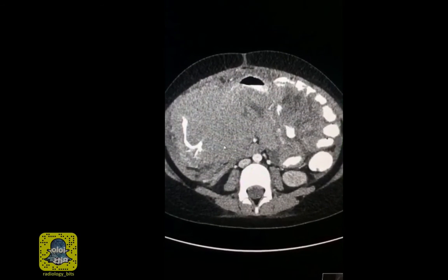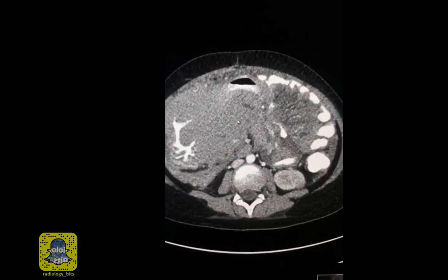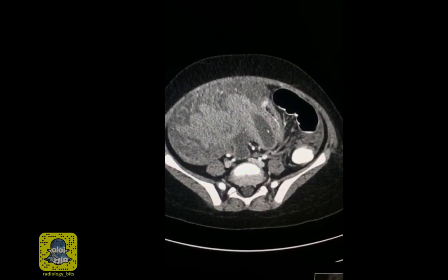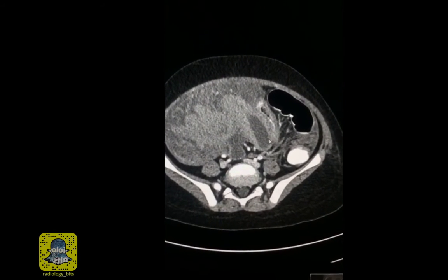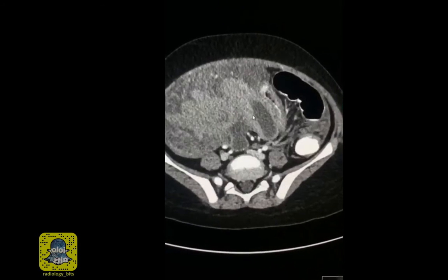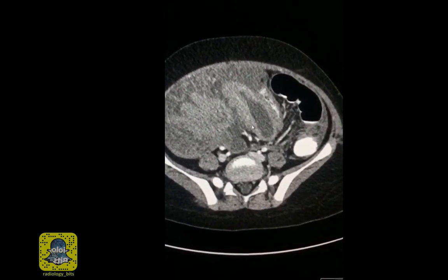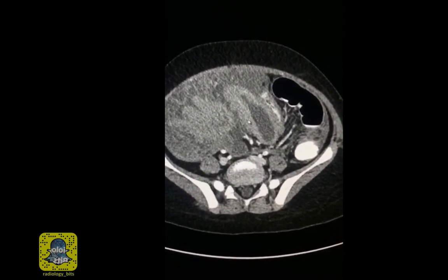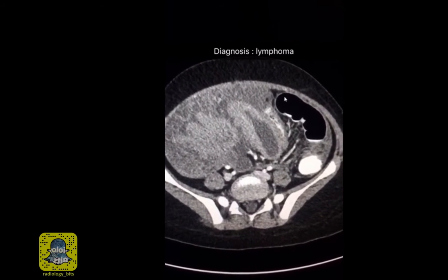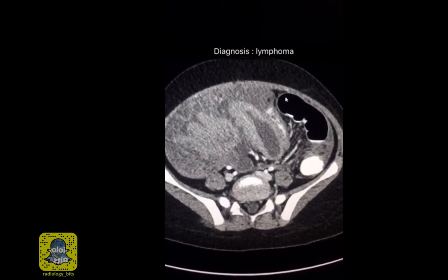Second, if you have involvement of the bowels by this kind of metastatic process, you'd expect to see obstruction. To the opposite of that, you see aneurysmal dilatation of the bowel loop, and this is a sign that's highly suggestive of lymphoma. The reason that lymphoma leads to this is that it's a relatively soft tumor that invades the neural elements in the wall and leads to the secondary dilatation. The case was a proven lymphoma after all, and the patient received chemotherapy.